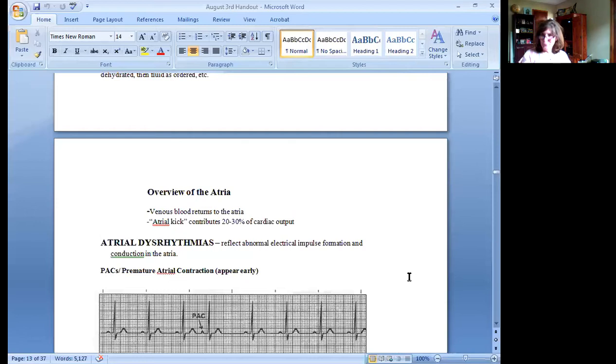All right, so we're finished with sinus rhythms. We've looked at normal sinus rhythm, the rates between 60 and 100, nice uniform P waves, leave it alone. Sinus Brady, if it's symptomatic, atropine's our drug, 0.5 milligrams, IV push, fast.